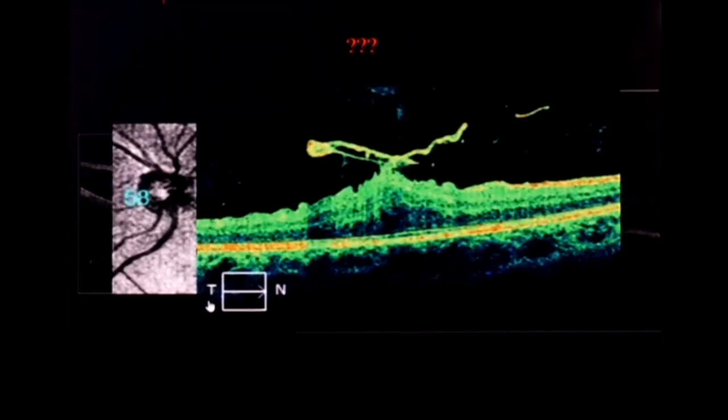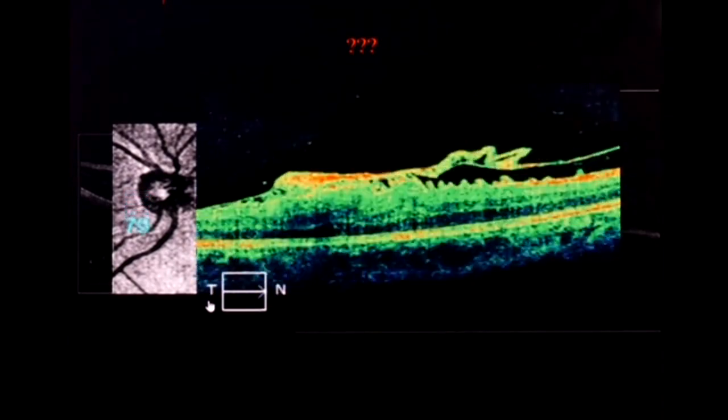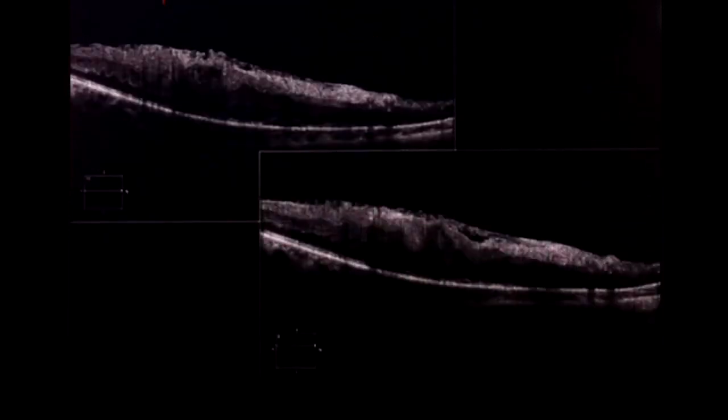So at this point, you would call it EIFL, but here you can see that there is a folding, and the outer nuclear layer stretches up to the very top. Again, another example, this is stage 4 here, but if you look here, this is less clear here, but there is an infolding of the foveal layers, and the surrounding layers have been brought closer together.